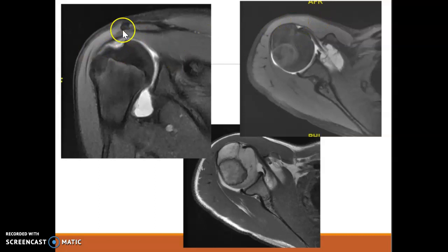And again, you've got this Hill-Sachs lesion here, acts like a cam. So every time they try and move, it can get stuck, and you get that anterior labral tear as well. So looking at the labrum itself, you're following around and looking at this lesion just here. You're looking for lack of fluidity of the labrum, and that would be your tear just there.